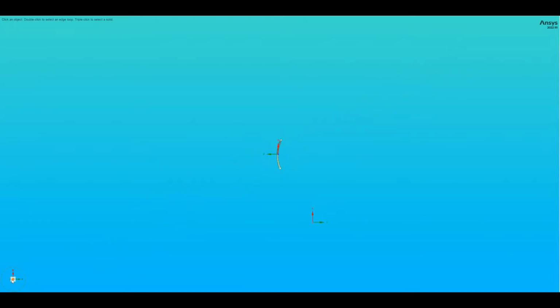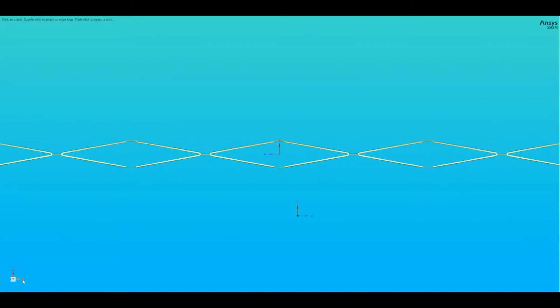The stent model was designed in the Ansys SpaceClaim program. In our case, we will limit ourselves only to a section of the entire stent, and more precisely to 1/7 of the circumference. We can design the stent as a whole, but our analysis will use the cyclic symmetry tool to speed up the calculations.